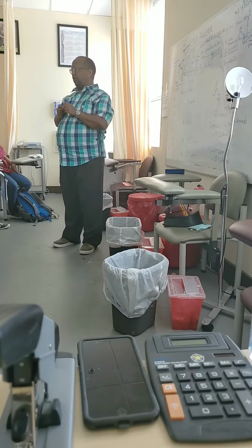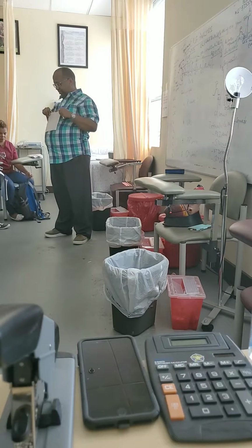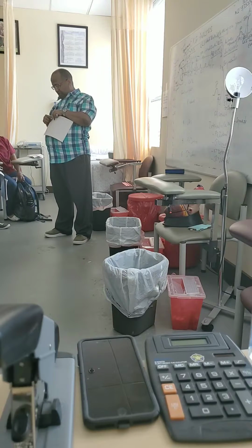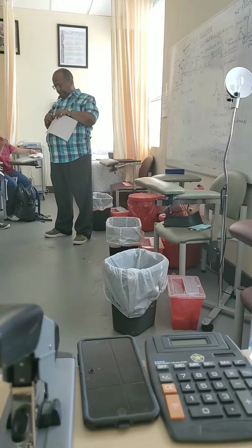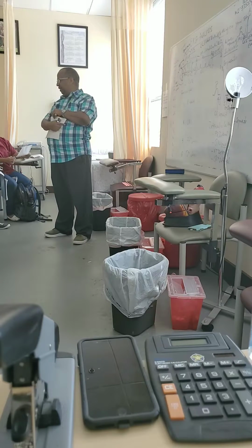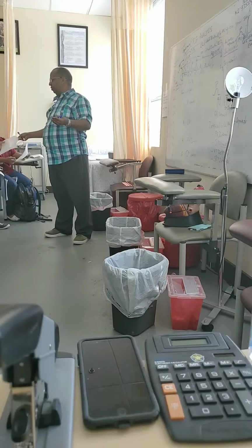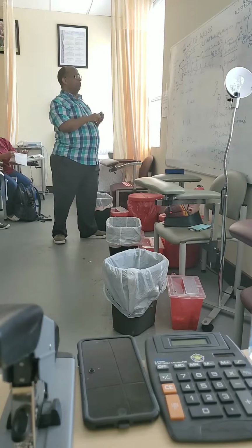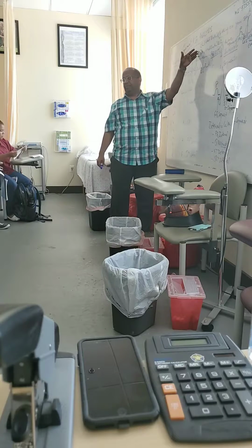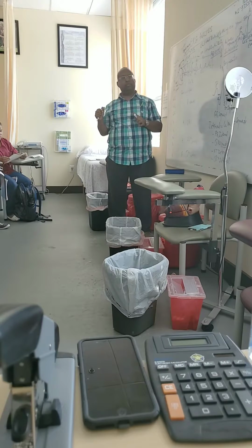So how do you check it? Get a small card and mark the gap between the R waves. Always use the second lead when you interpret. Mark from here to here and then check all over whether it is the same. If it is the same, it is regular. If it's not the same, it is irregular. The first thing you need to do is determine the rhythm, because the way you do the rest depends on the rhythm.